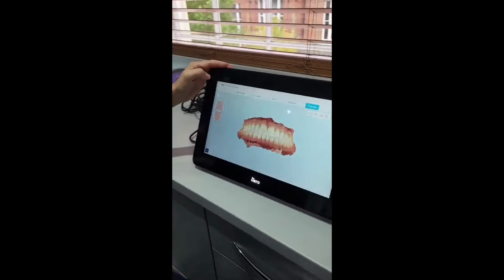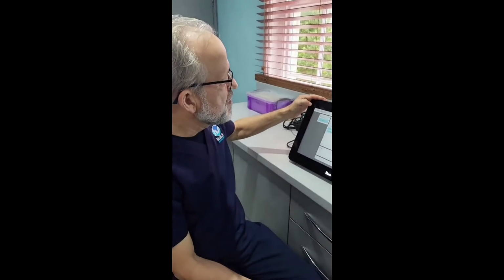So that is the Align Oral Health Suite. What an incredible AI-driven tool to show the patients what's happening in their mouth now, and also, if we do it on a regular basis, to understand the dynamics of changing their mouth as well in terms of monitoring.